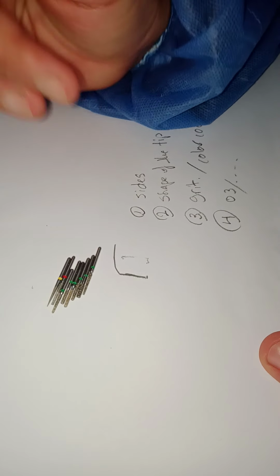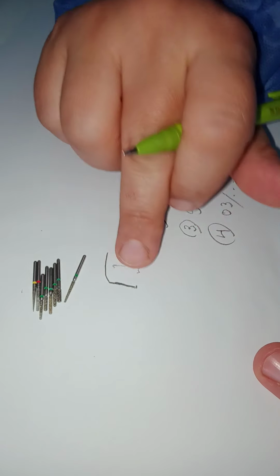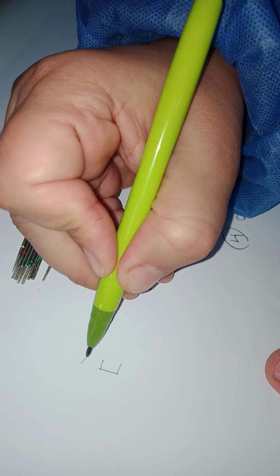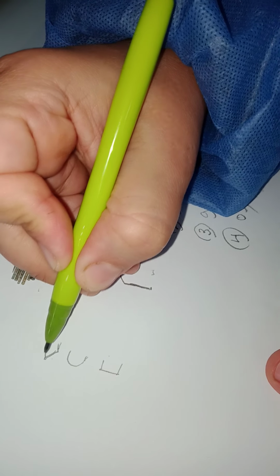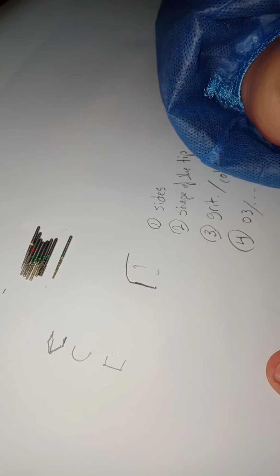Okay, this video is our second video talking about the burs and the finish lines, concentrating on how we create the finish line using these burs. We said that the burs have different shapes of tips. So we have the shoulder tip of the bur, those that have a rounded end, and those that are like a chamfer, like a triangle. You feel that the tip is like a triangle. These are the three shapes of the end of the bur.